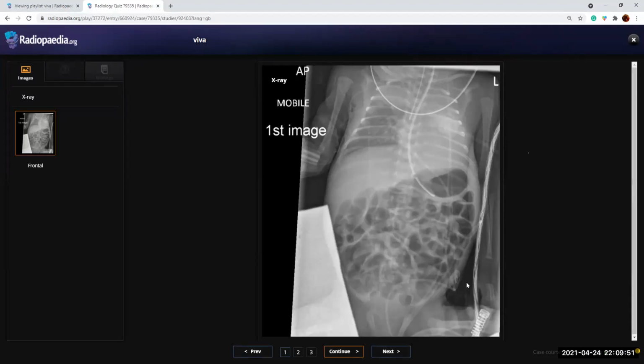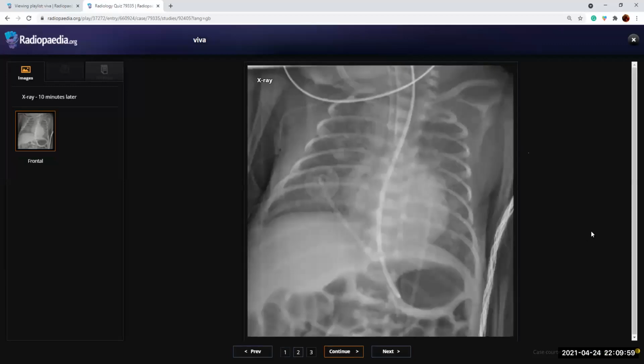You told you'll tell them to withdraw. Do you want further imaging after that? Yeah, a follow-up X-ray would be helpful. Okay, so this is the X-ray taken after they've withdrawn the endotracheal tube by a few centimeters, and the areas of opacification in the lungs appear to have cleared now. So basically, I think it was due to the malpositioned endotracheal tube.